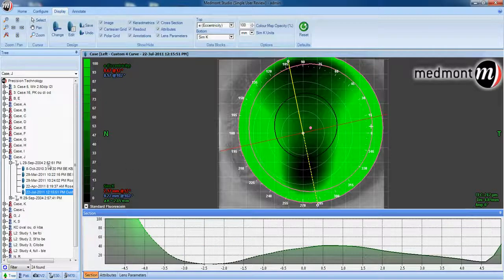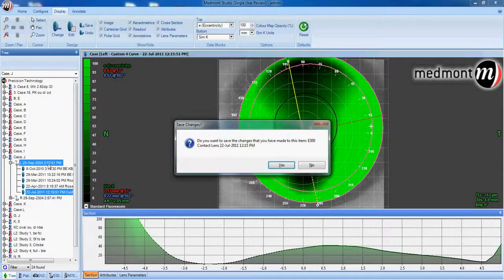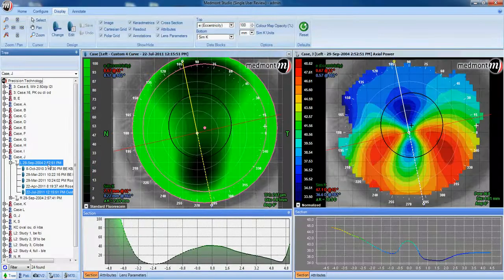This concludes video 10 on the review of functions and usage with your Medmont E300 corneal topographer.